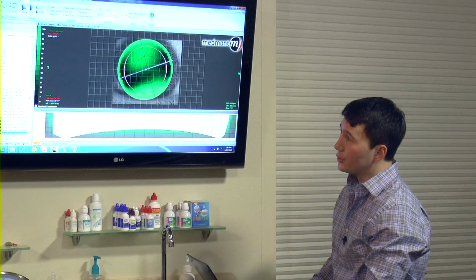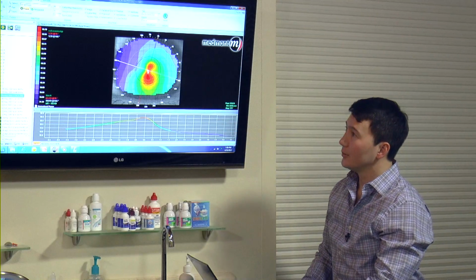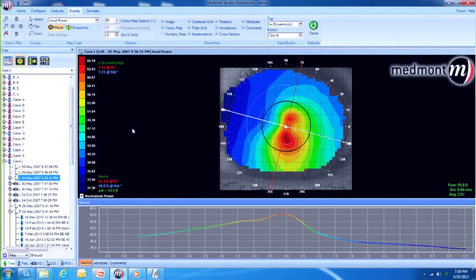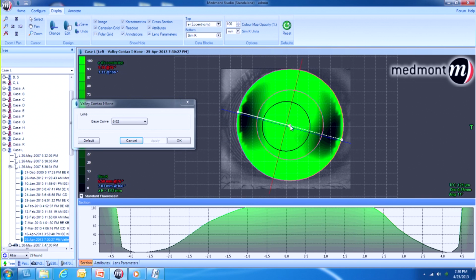Have a look at this same patient's fellow eye. Central keratoconus, to me, when I see that, I think should be fairly straightforward. Because the cone is so centered, then I'm hopeful that I can align the lens around here, 360 degrees. But let's pull up the theoretical contact lens. Let's put on the iCone again and pick up our contact lens, put it on the geometric axis, click our cursor in the center. We have 122 microns.